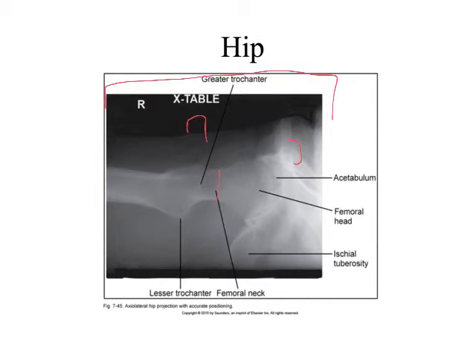So it is a higher contrast image. But what's nice about this is we have the femoral neck demonstrated without any foreshortening. And we can see the lesser trochanter very clearly. So if we suspected a fracture, we now have a way of imaging that neck of the femur.